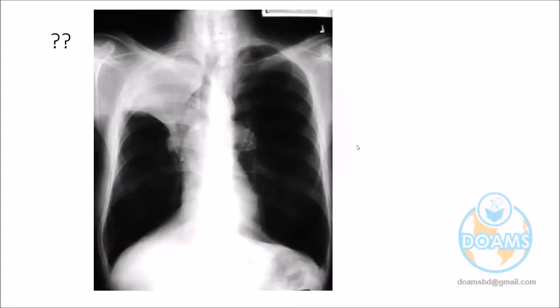Now here, answer. What is diagnosis? Very quickly. Right side consolidation. Open your eyes. Dr. Hind, too dark, very dark. No, I am not asking the dark area. Look at the white area. What is the diagnosis?